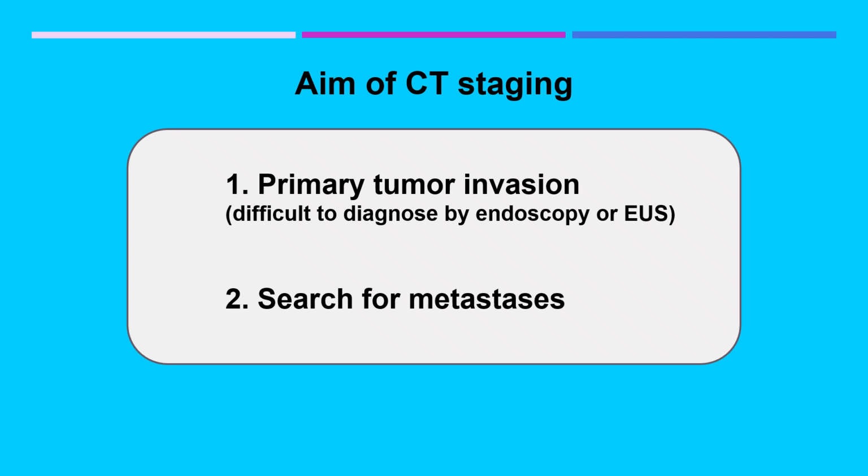The main aims of CT staging are to evaluate the depth of tumor invasion, to detect lymph node metastasis, and to search for distant metastases such as in the liver or peritoneum. Accurate CT staging supports clinical decision-making and improves patient outcomes.